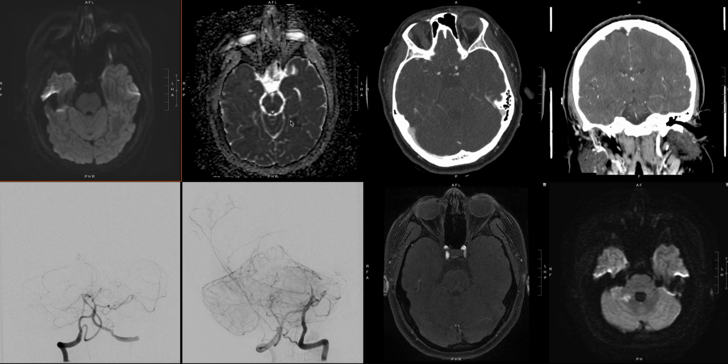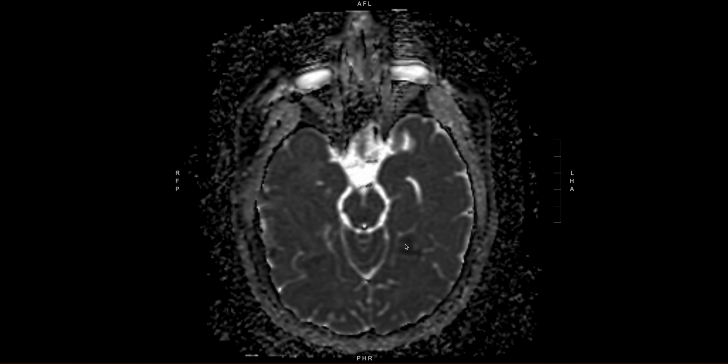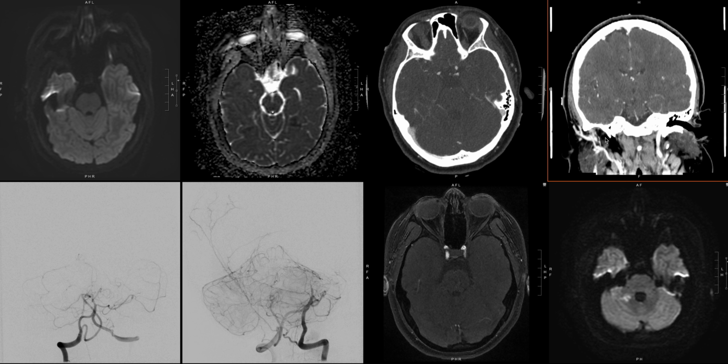And if we look at the ADC, it is dark, corresponding to new acute infarcts in that left occipital lobe. So overall, this is a slightly different look, but the same principles apply. We did not get a non-con CT at this point because we had the findings on the MRI and we wanted just the CTA. But the point is our axials and coronals work really well together, and even though this basilar thrombus looks different, you still want to have a very similar approach on call, which is to escalate to neuro-IR if possible to make sure that the patient has the possibility of timely treatment.